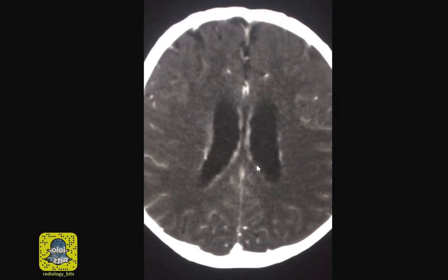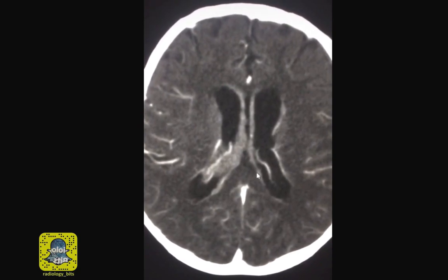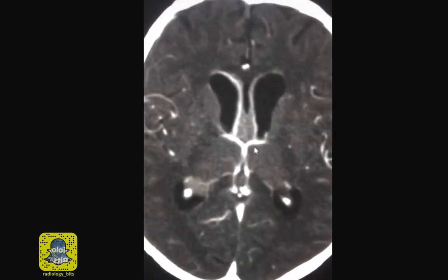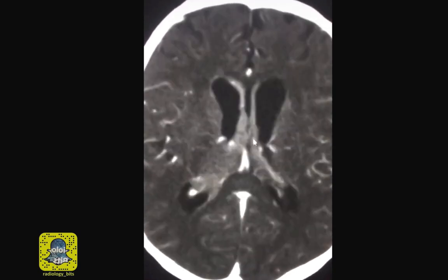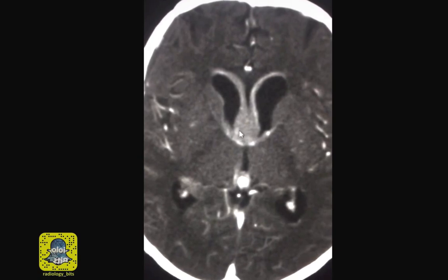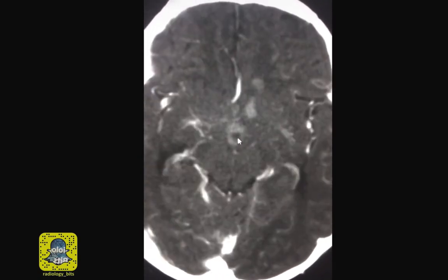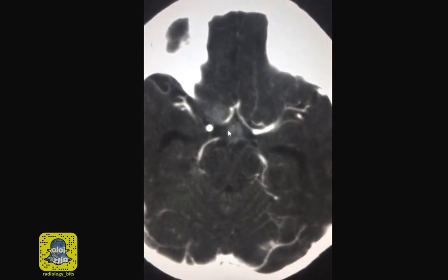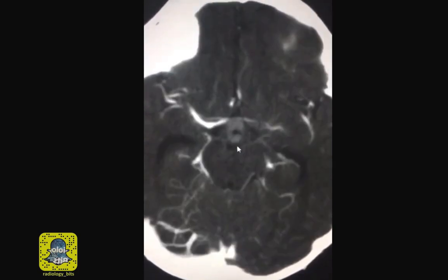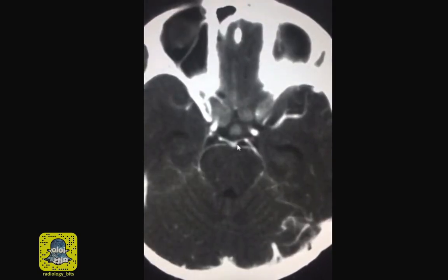The intravenous contrast study demonstrates the same expected abnormality, but in a better fashion. Now you see thickening of the ependymal lining, which is nodular and extremely thick in some areas, such as at the region of the foramen of Monro. This abnormal enhancement and thickening extends to involve the pituitary stalk, and it also involves this posterior area, which we would better address when we look at the sagittal imaging.